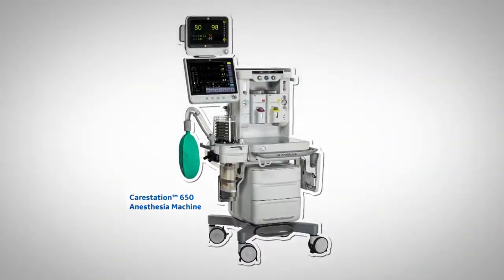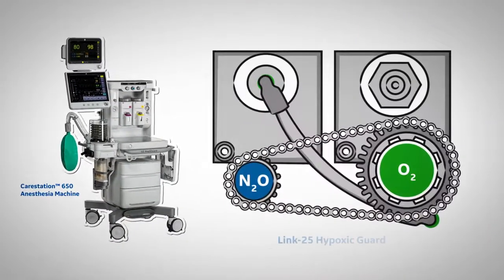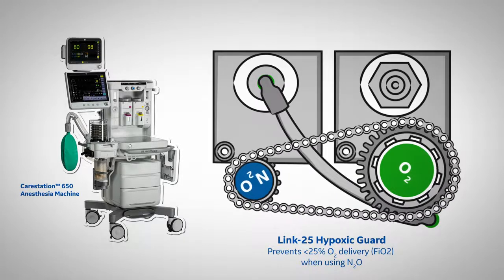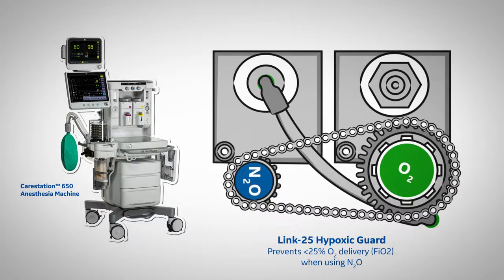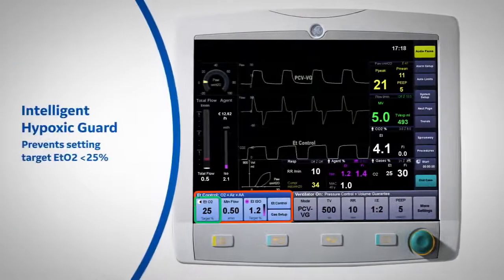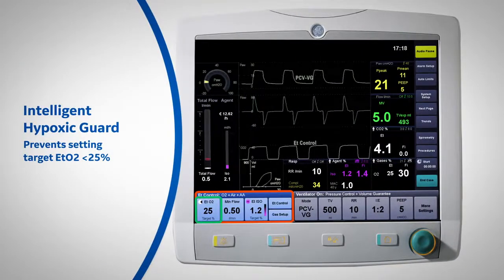With manually controlled circle anesthesia systems, there are conventional hypoxic guards that control the oxygen percentage in the fresh gas flow and not the circuit FiO2. This could result in hypoxic levels of inspired oxygen. GE Healthcare's Aisys CS2 end-tidal control contains an intelligent hypoxic guard, since the oxygen percentage is controlled at the patient level by automatically compensating for the metabolic rate changes, ensuring targeted end-tidal values.